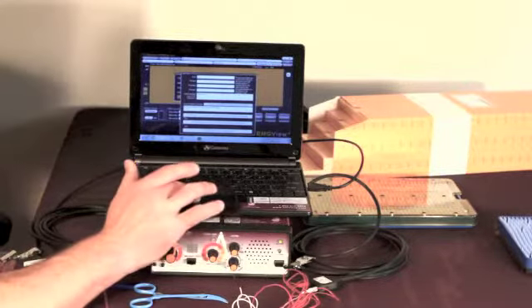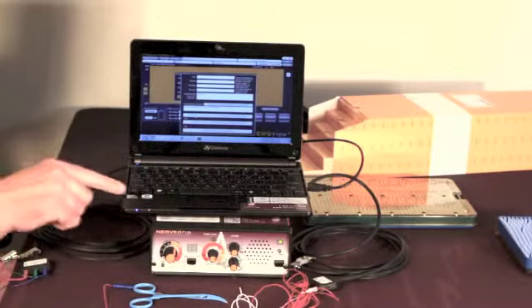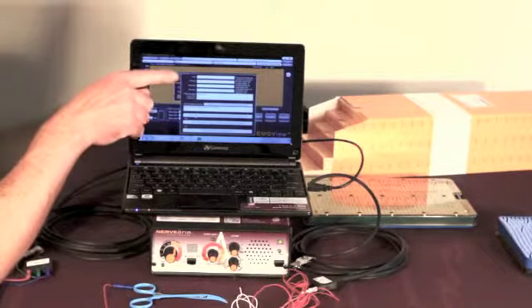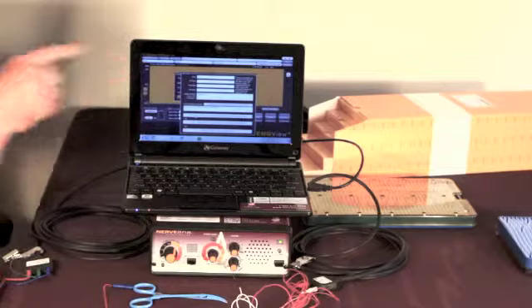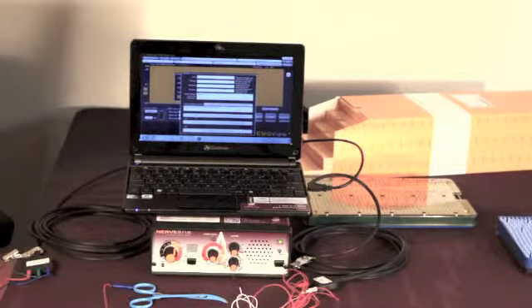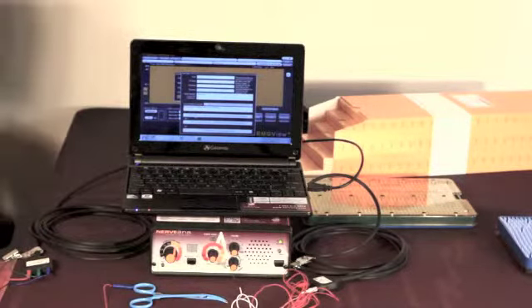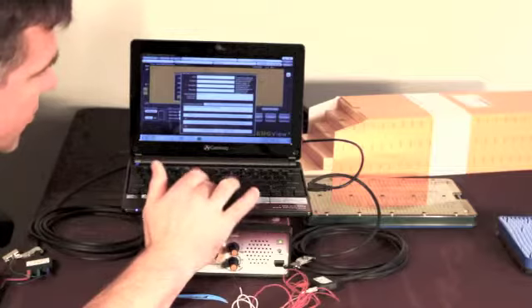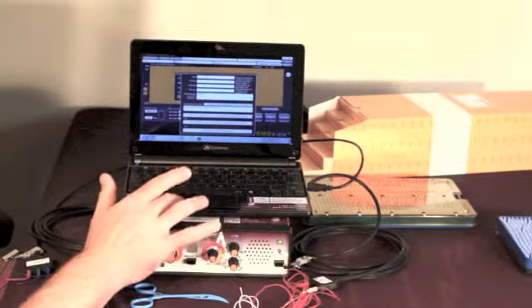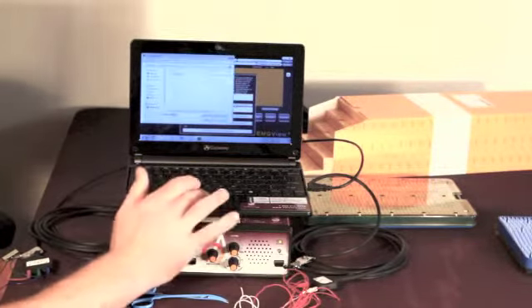We'll go ahead and start a case and record. Oh, and one other point I want to make is that you're able to add patient ID information, any notes, who the surgeon is, what the procedure is, and you can also choose where to save the file on the computer. And in fact, I'm going to go ahead and change that right now because I've created a location on the desktop where I'd like to save my recording of this case.